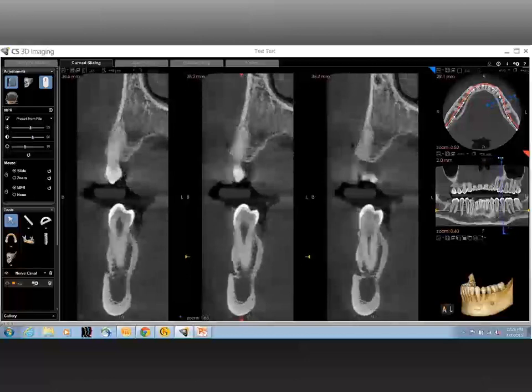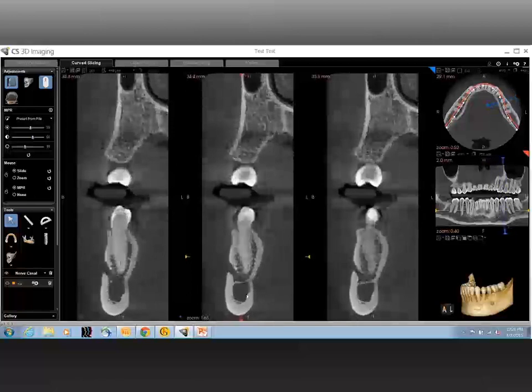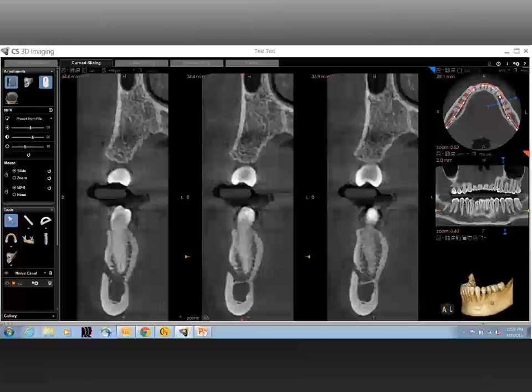So the mental foramen, one of the key structures to be noted around the premolar area, is very prominently visible. Just like as you see over there, you'd see a clear separation from the inferior and the superior aspect. Excellent. I think that should explain that.